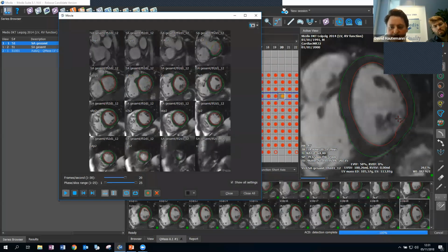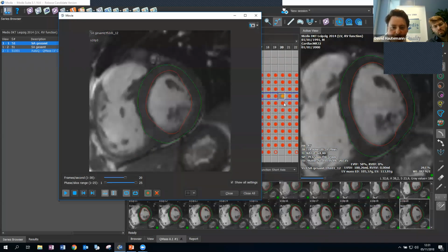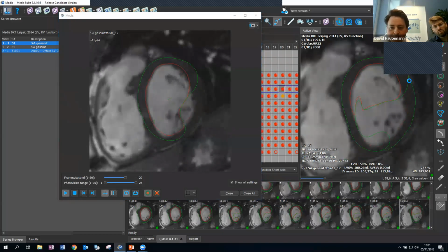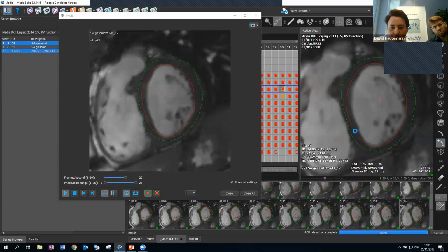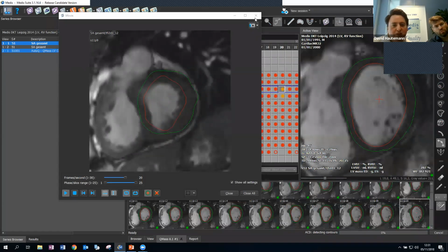What I did here is I edited one contour, and with the time continuous detection, I can fix this problem. So let me just show you again here on this other slice. The epi is already fixed a lot, and maybe the endo, or you can also still use this live contour option that you might be familiar with. And that will also help speed up, get the contours approximately the right place.